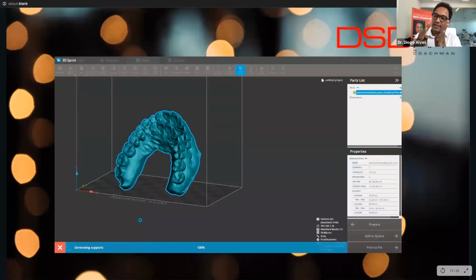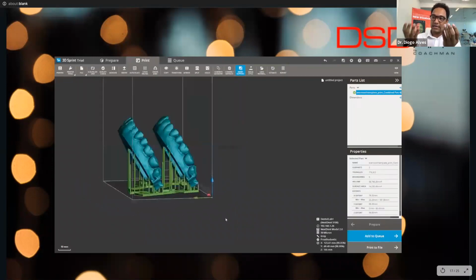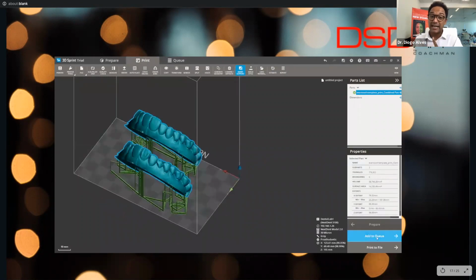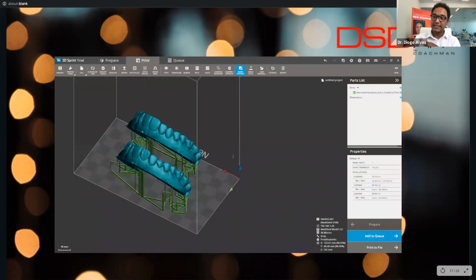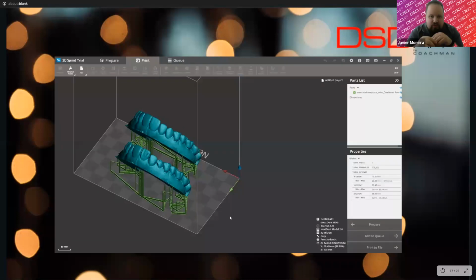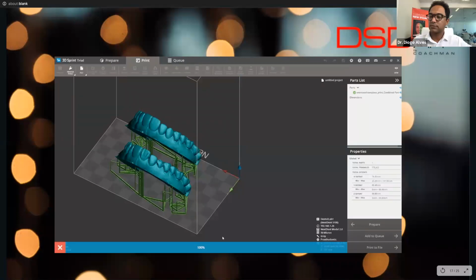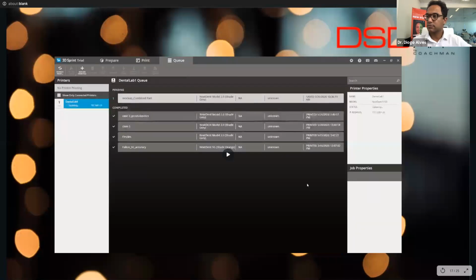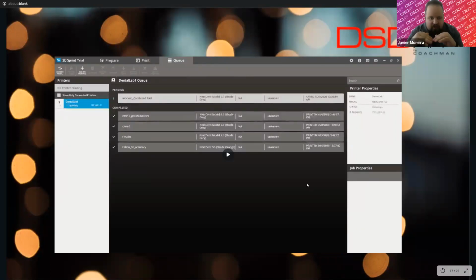So basically, once we print it, we will make 2 clear silicone indexes using those, and then you'll be able to use them for your injectable composite veneers technique. And that's something that you don't have to do. The app will already export for you like that. That's correct. Straight from the app, you'll be able to choose odds and evens mock-ups or the final printable model. All of that comes out straight from the app, all with one click, honestly, with just an export click. It'll bring you all your files. You just have to make sure that you've generated them correctly.